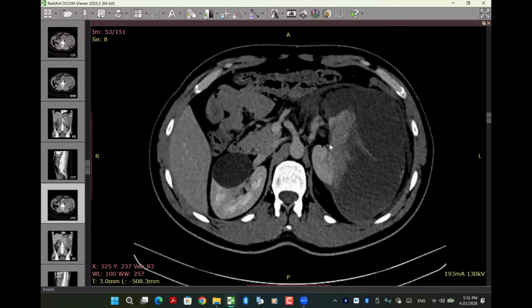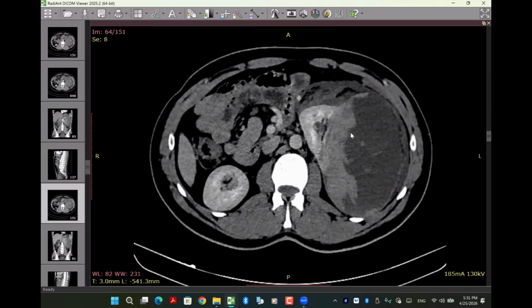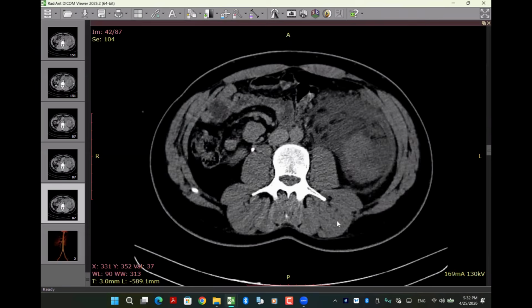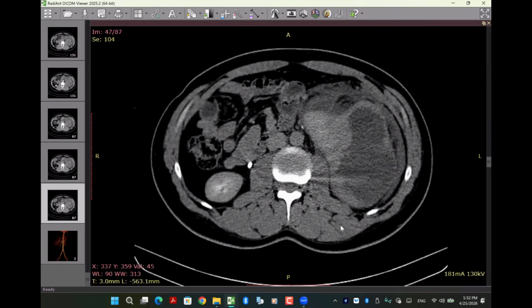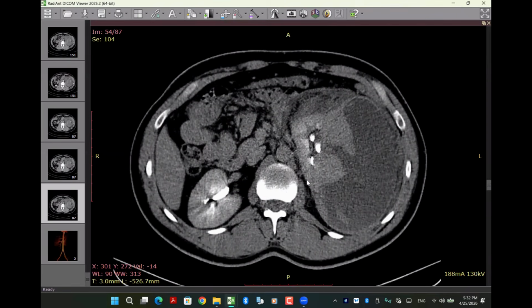So what else question should you ask the clinician about this one? I will ask the history of any hemolytic disorder, and history of anemias. Exactly. History of anemias and hemolytic anemias, in which spontaneous hematoma formation occurs. What benefit do you have from this delayed image?